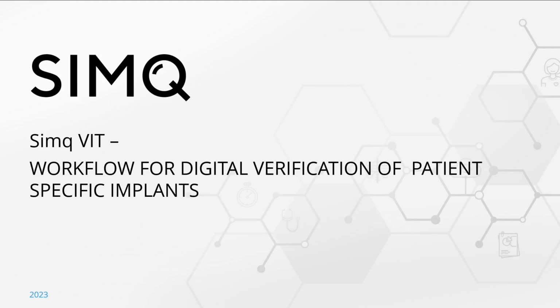In this video, I will show you the 5 most important features Simq VIT has to offer. We recommend these features be evaluated when designing an implant. We will also show you how you can better explore your simulation results.